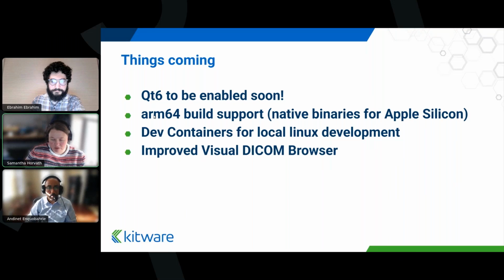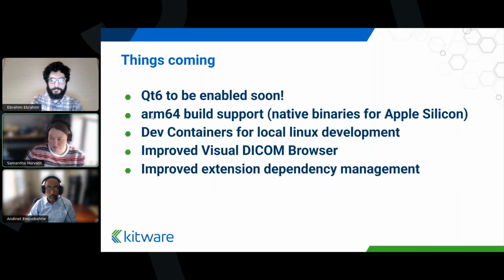New features that are coming along are the improved visual DICOM browser, which modernizes the interface of the current DICOM browser, and improved extension dependency management, so we can manage Python packages that are installed by extensions to reduce the likelihood of version mismatches and crashes, and we can better support more complicated interactions between extensions.